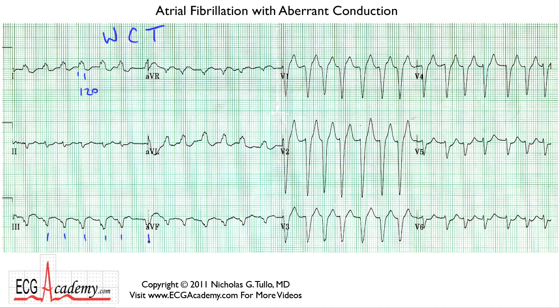But sometimes it slows down. Here, this interval is more about 125 beats per minute, and then it speeds up again to more like 180. So it's irregular, and there's no apparent pattern to the irregularity. You can see it gets faster and then a little bit slower, but the QRS always stays the same. It stays that same 120 milliseconds or so.